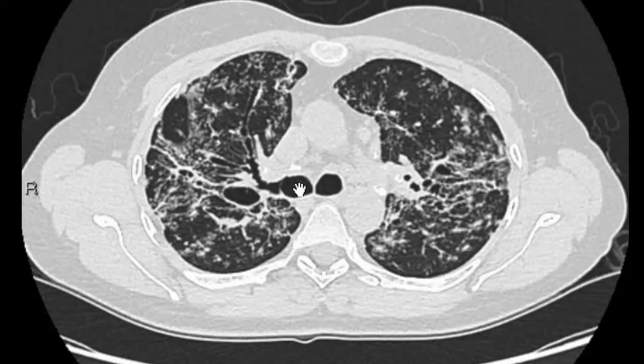So this is the carina here, right main bronchus, left main bronchus, and you can see traction bronchiectasis here, here, and here as well. So the dilatation of the bronchial branches is visible clearly. This is a bit small from here and a bit more dilated from here. You can see the thickened walls of the bronchial branches. A normal bronchial tree should taper towards the periphery, which is not the case here.